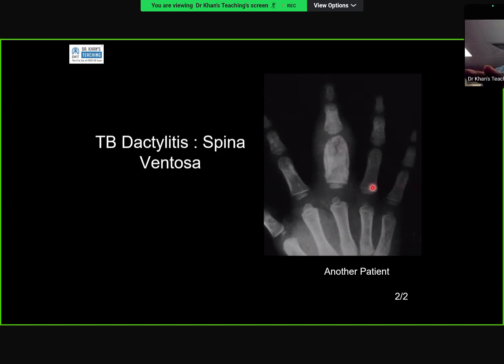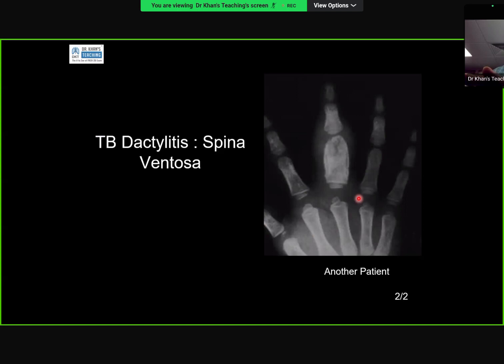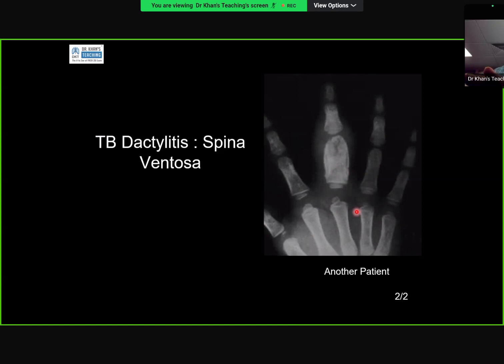By the way, syphilis dactylitis is a differential, though I did say that this is an Aunt Minnie because of the expansion of the medullary cavity. Enchondroma will be a lucent lytic. This is not a lucent lytic lesion. And that will be a lytic lesion, and that's different. Second thing is that in syphilitic dactylitis, there can be thickening of the phalanx or the metacarpal, but that is because of cortical thickening, periosteal reaction. So expansion of the medullary cavity, just remember that.